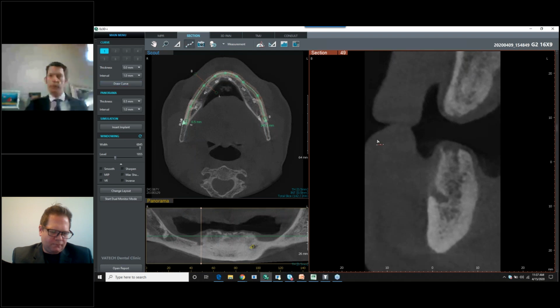And I'm going to click through. And we can click here. And I'm just going to follow the center of that bundle. I'm seeing my bundle here.